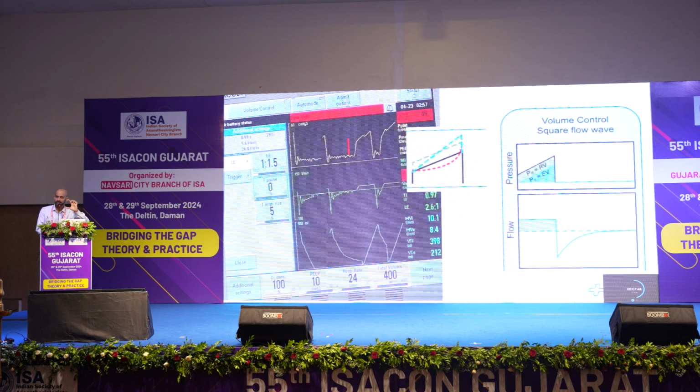Remember we talked about the step up? The black step up means it should just be a few centimeters of water and then it should transition to the linear increase in pressure. But see the step up here, it's pretty big. Right? That initial step up is very high, which means all the work that the ventilator is doing in the first few hundred milliseconds is to overcome resistance. So the resistance work is very high, therefore this load is called a resistive load in inspiration.